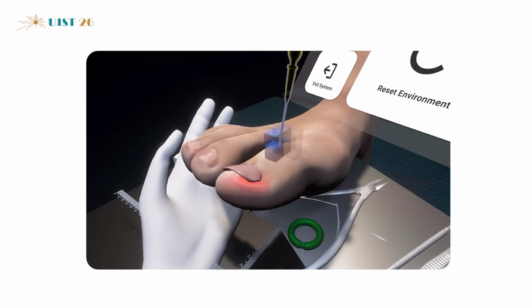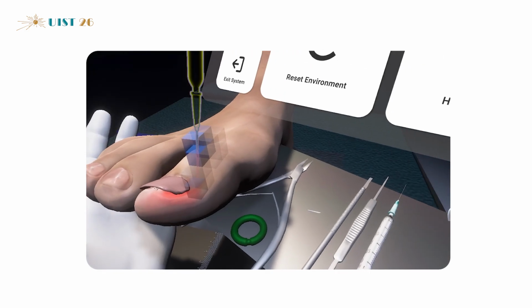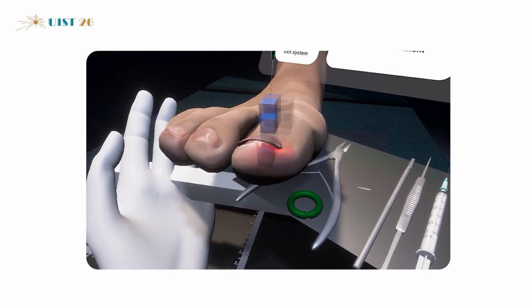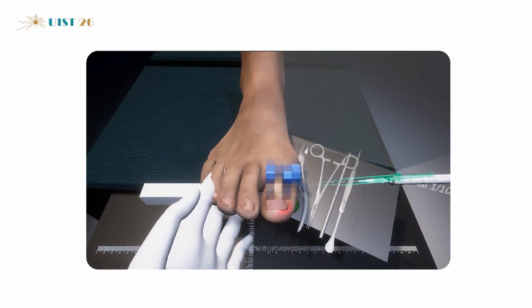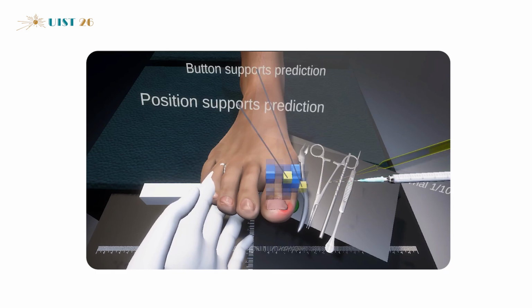As the user's surgical attempt unfolds, multimodal information is written into 3D voxels along the user's path in the original workspace, allowing evidence to accumulate only in the regions the user visits. As evidence accumulates across the visited voxels, VoxelTrace forms its final prediction, classifying the trainee's surgical attempt as successful or needing review.